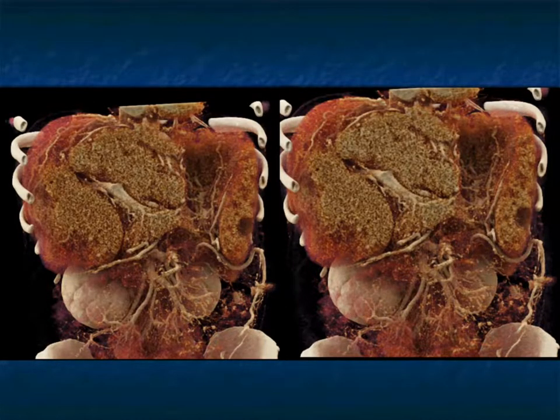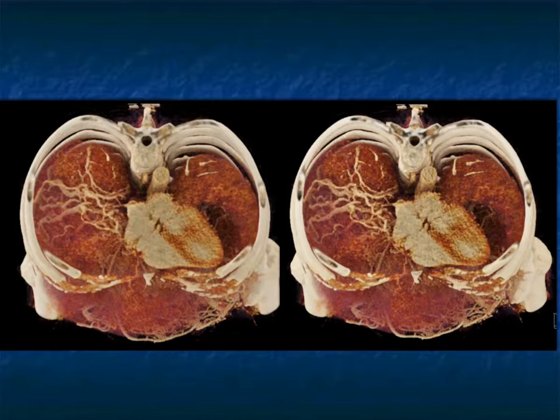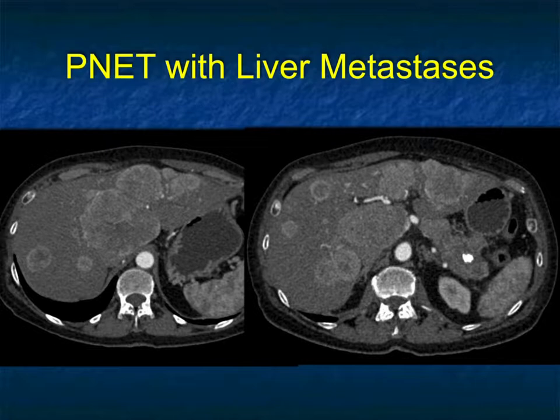You see the lack of visualization of the hepatic veins, but good visualization of the portal vein. Again, the textural mapping from above showing the collaterals. Infinite number of perspectives, but we try to accentuate the information we're showing the user.